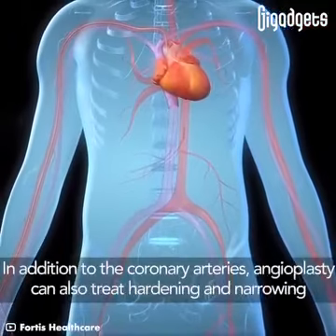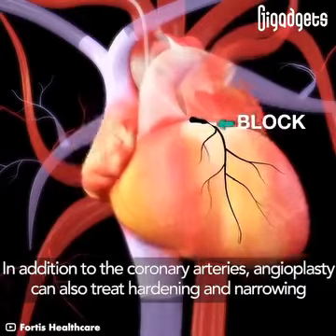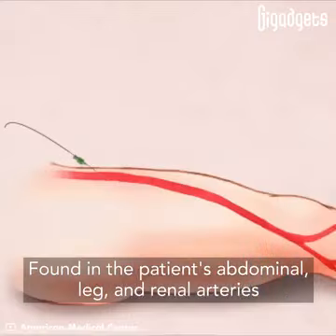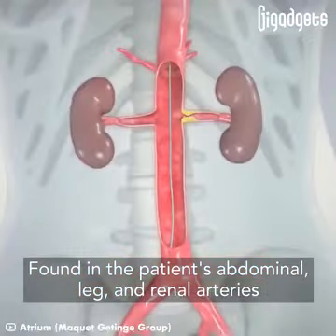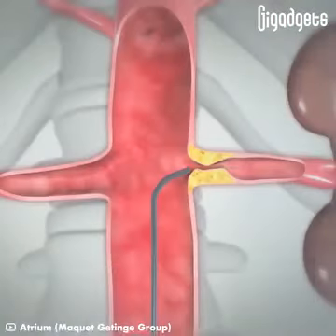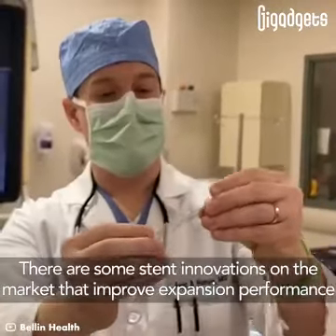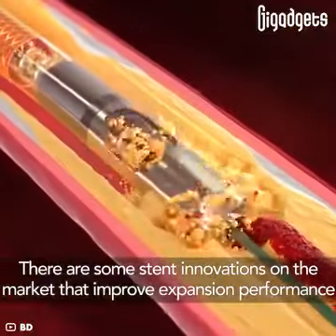In addition to the coronary arteries, angioplasty can also treat hardening and narrowing, found in the patient's abdominal, leg, and renal arteries. There are some stent innovations on the market that improve expansion performance.